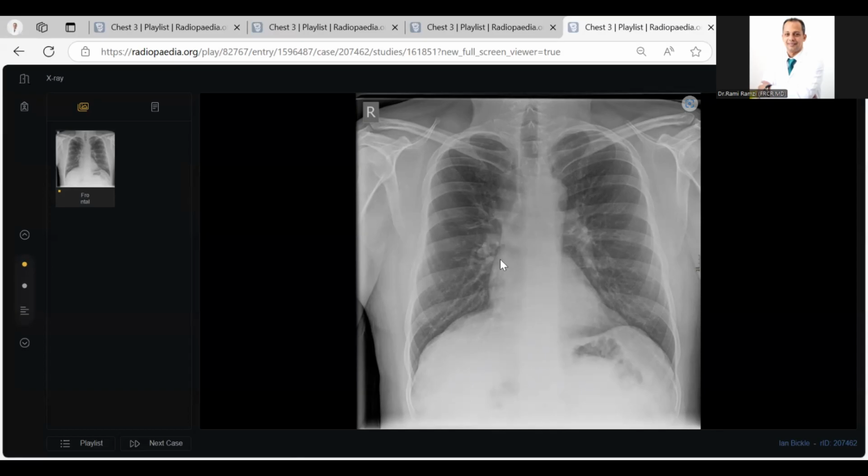I think half of it. So you should also mention at least that you suspect. If you say I suspect there is some volume loss, it will not be harmful for you. But overall, very good. Dr. Miga, who is the second candidate? Second is Dr. Akida.